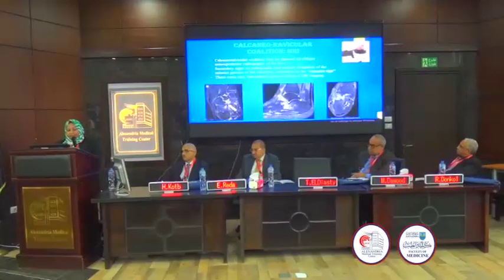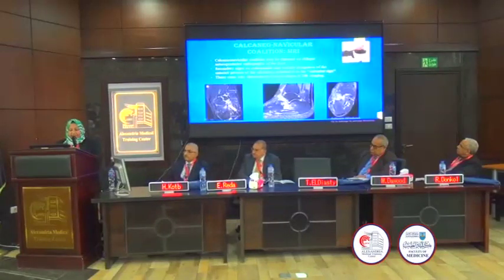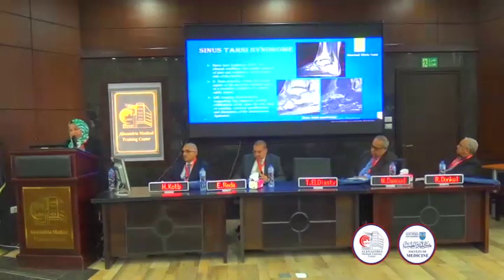And then by MRI, there will be edema at this elongated anterior process, and we can see the connection between the posterolateral aspect of the navicular and the elongated anterior process of the calcaneus, with bone marrow edema coming across and the irregular bony interface at the interface of both bones.